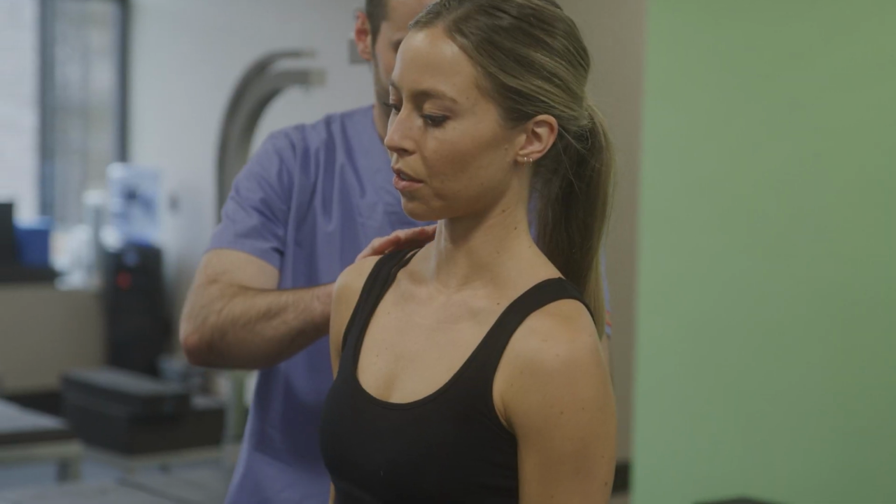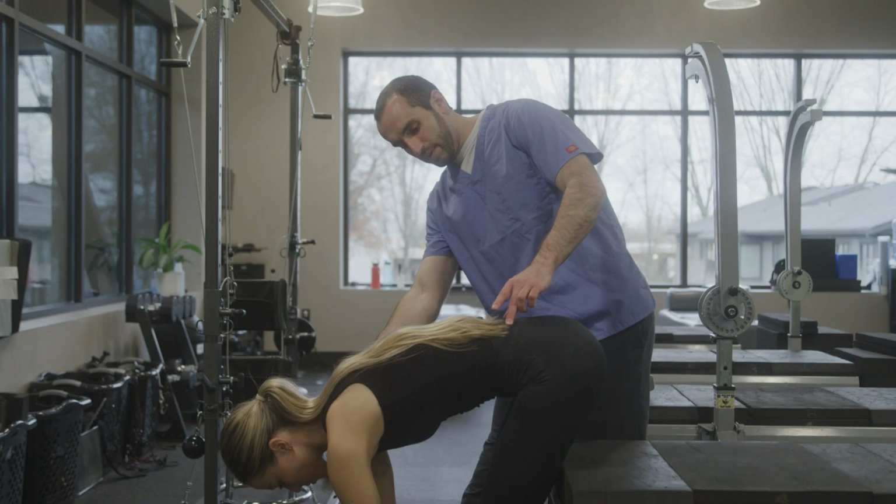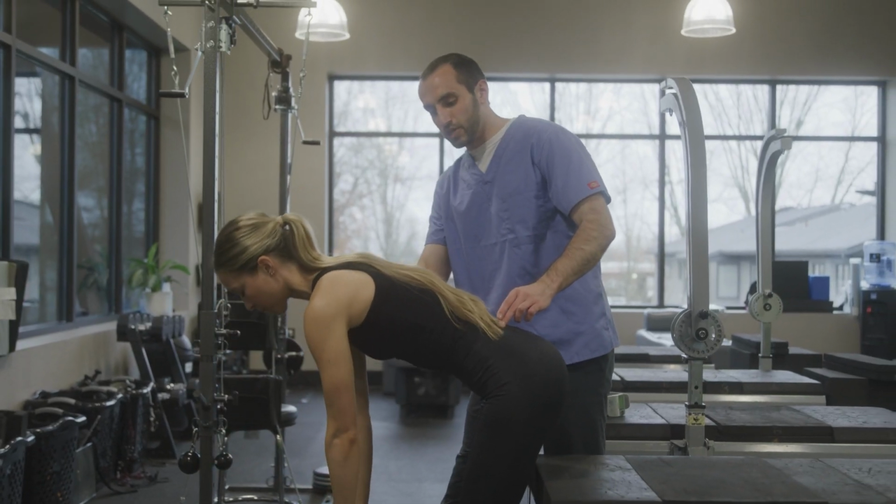So X-ray imaging can not only tell us where it's located, but if we do X-rays with movement, meaning a patient bending left and right, we can also determine how flexible a spine is, and this can help us predetermine how responsive a scoliosis will be to treatment. So not only can it tell me where it's located, it can also tell me how stiff a spine is. It can also tell me how a patient can respond to treatment if the curve is flexible.